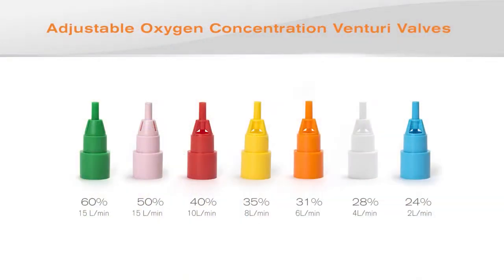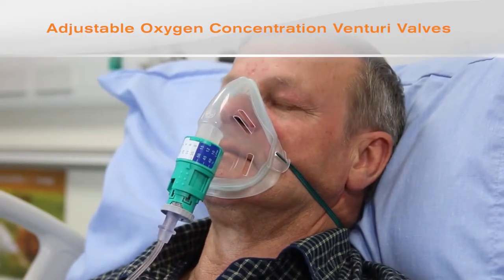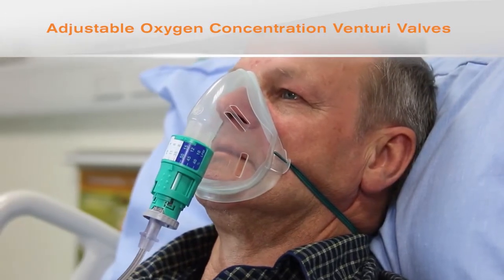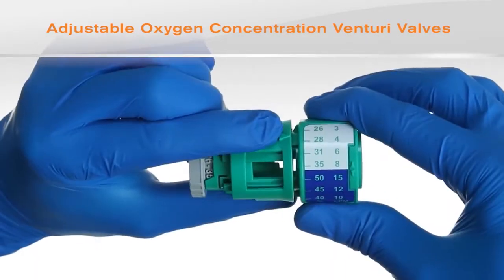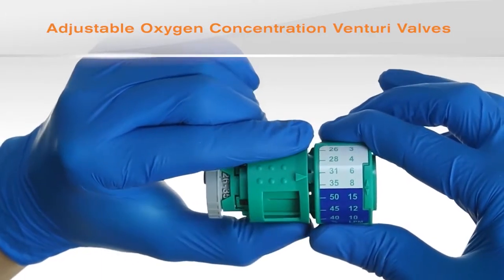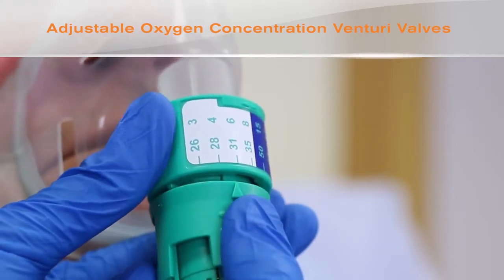A disadvantage of fixed concentration Venturi valves is that in order to change the concentration delivered to the patient, it is necessary to change the valve. This can be overcome by using an adjustable Venturi valve. With an adjustable Venturi valve, the rotation of the sleeve increases or decreases the size of the air entrainment window. This in turn changes the oxygen concentration. This means that the same valve can deliver a wide range of concentrations.